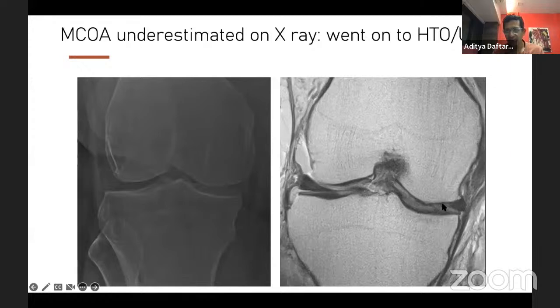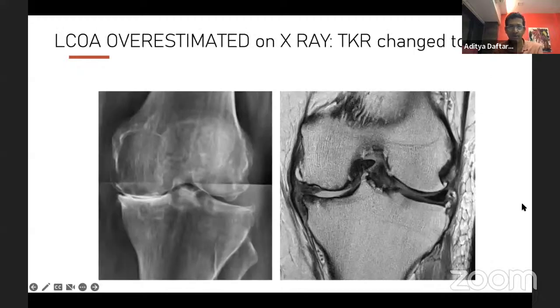But if you look at this, you can see complete femoral-sided articular cartilage loss, and you can see tibial-sided cartilage loss. Just as we have gone from a world where we thought all OA should be treated with a total knee arthroplasty to unicompartmental arthroplasty, because we are seeing medial compartment involvement and spared lateral compartments, I'm seeing a trend of greater involvement of only the femoral side and not really the tibial side. As many of you know, there is early work on even a quadrant arthroplasty, where you just replace a part of the femoral condyle. So this is some of the stuff where I think MR will play a role in osteoarthritis.